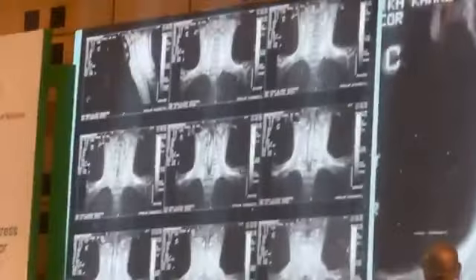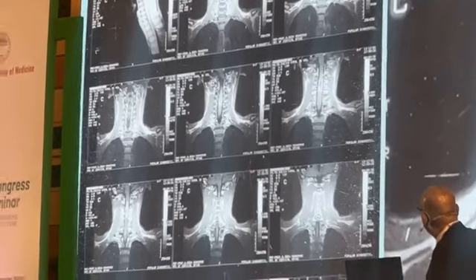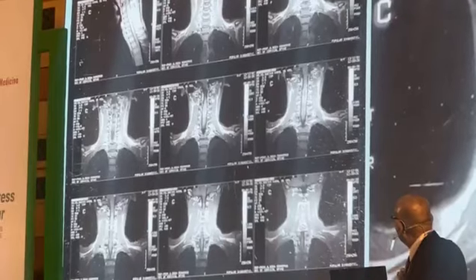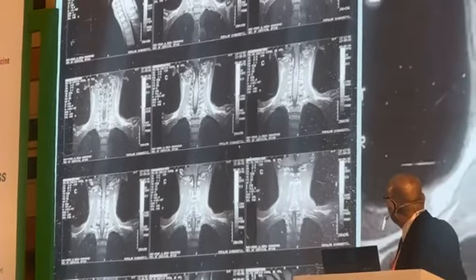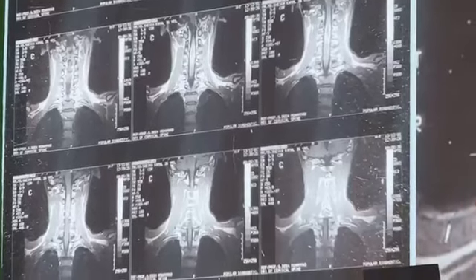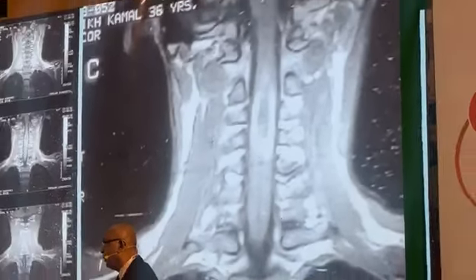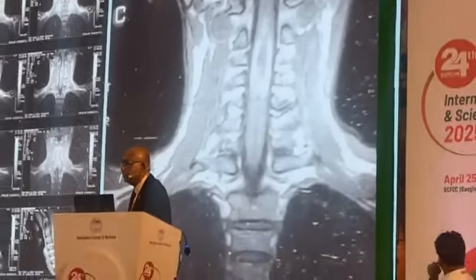Right. This is an intramedullary space-occupying lesion. So contrast enhanced, can you see? A bit elliptical, but marked peripheral enhancement. There is no gap anywhere. So this is an example of an intramedullary space-occupying lesion, either ependymoma or astrocytoma, probably.